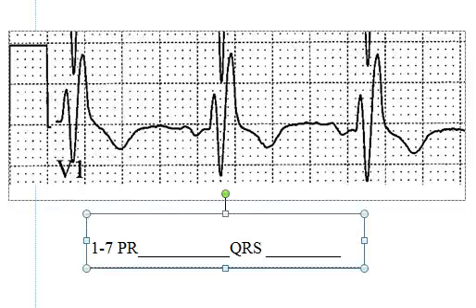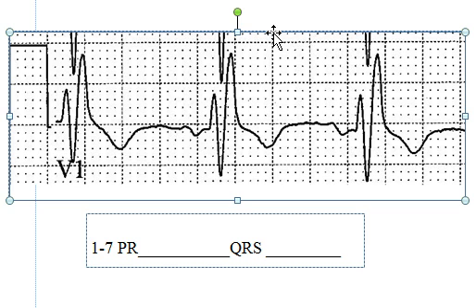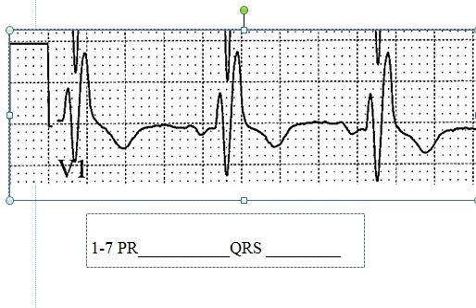Okay, we are on in-class practice page 1B and strip number 1-7. We notice that we're just asking for PRs and QRSs here. This is a funky looking PR and a QRS, so let's take a look at it. First of all, you see that this P wave starts by going up and then goes down.